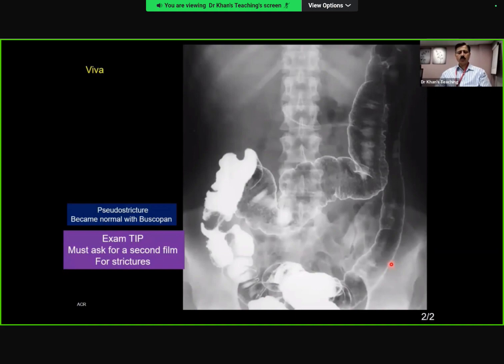Transmural versus superficial, and this helps you make radiology. So deep ulcers will be seen in Crohn's disease. On the other hand, in ulcerative colitis, it will be quite superficial. There will be no fistulae in ulcerative colitis. There will be fistulae in Crohn's disease. Skip lesions is Crohn's disease. Ulcerative colitis will be continuous disease. Now, if you look carefully, what is happening? So this is one teaching point here.